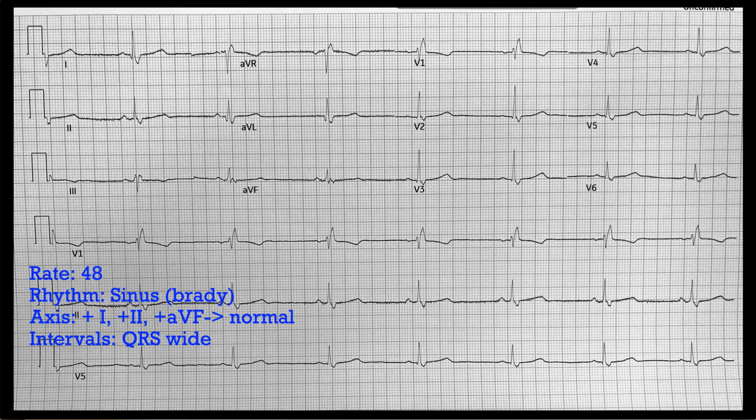When we think wide QRS, we think that there must be some kind of block, some kind of reason that the myocardium is not conducting as fast as it normally would someplace. So we can evaluate why that might be.